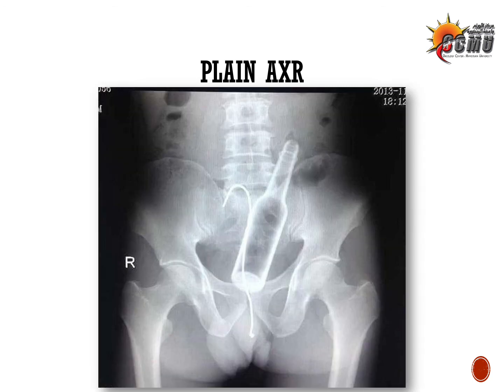Another view of a man who had a bottle inserted in the rectum, and actually he tried to fish it out with a hook, and both got stuck. And he came to the emergency department again, and they extracted both of them. Okay.